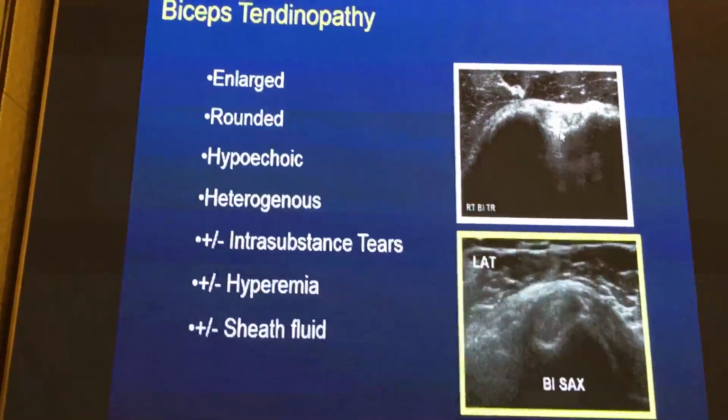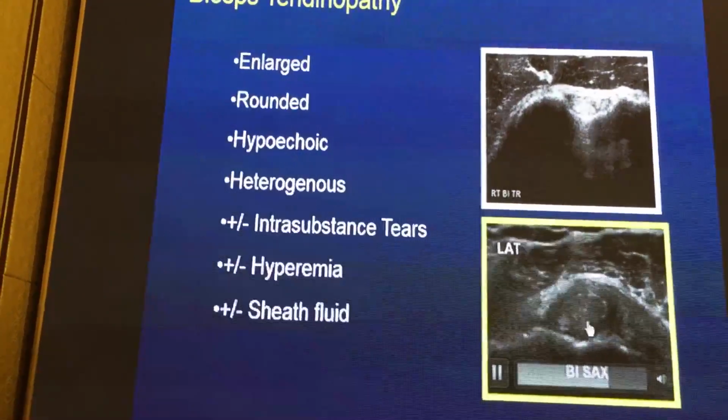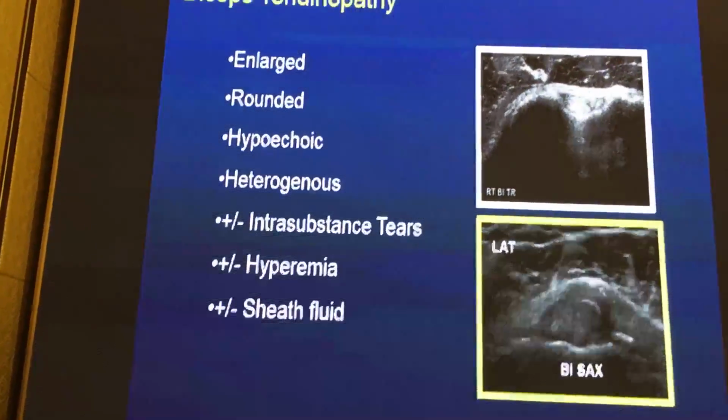So if you look at this, normal biceps tendon, look at this giant hypoechoic biceps tendon. That's gotta hurt.